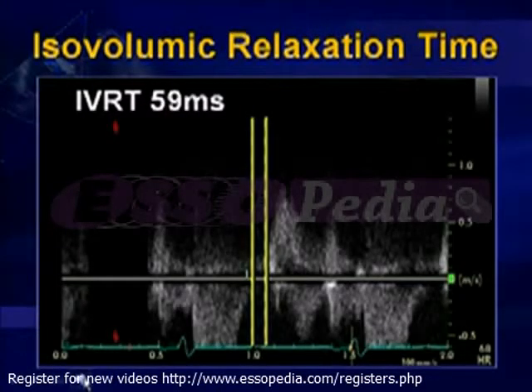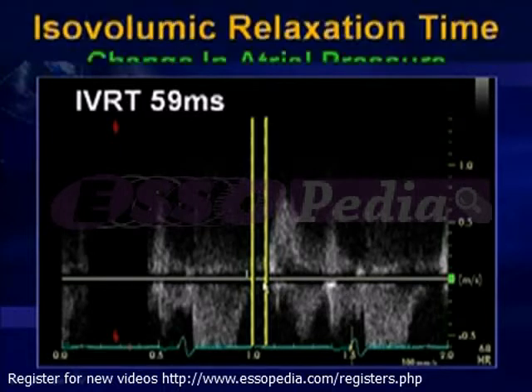Now, although not directly reviewed in these cases, at times it can be very informative to acquire additional information from the mitral inflow velocity profile, such as the isovolumic relaxation time, obtained with continuous wave Doppler in the LV outflow tract to simultaneously display the end of aortic ejection and the onset of mitral inflow.